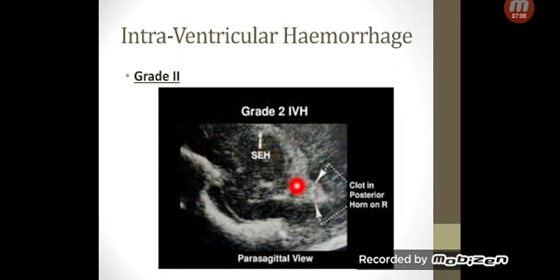But here's another teaching. What is this? This is obscuring the posterior horn, while the choroid plexus shouldn't do that, it should be lying on the curvature. So this is a clot in the posterior horn, which is coming from this hemorrhage being a bit old, so it formed a clot back there. This is not the best picture for a grade 2, but I found it interesting just to show also that you can find extensions that can be timed.